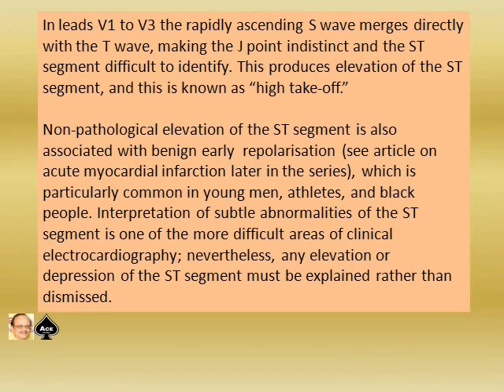In leads V1 to V3, the rapidly ascending S wave merges directly with the T wave, making the J point indistinct and the ST segment difficult to identify. This produces elevation of the ST segment, and this is known as high takeoff. Non-pathological elevation of the ST segment is also associated with benign early repolarization. That is mentioned in one of the videos on acute myocardial infarction earlier in the series, which is particularly common in young men, athletes and black people.